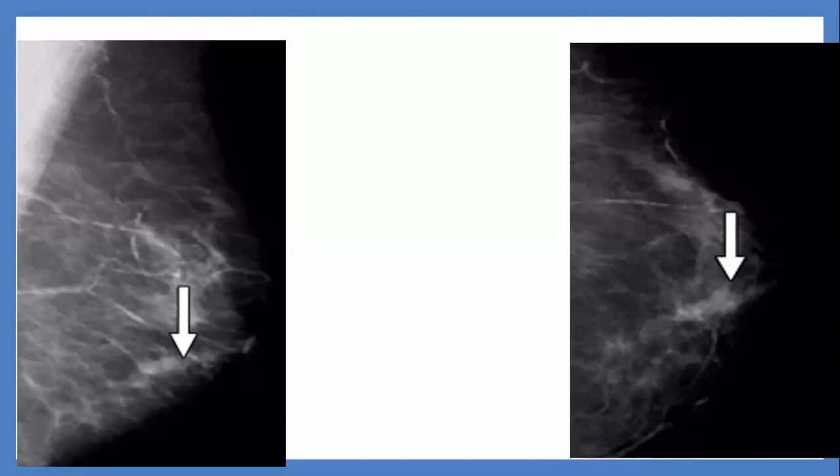Okay, again, can you describe it? In the lower inner left breast, there is what? Is it a mass or something? Looks like an inverted opacity. What is the shape of this opacity if you look at the MLO? Tubular. Yes, you have a tubular opacity radiating from the nipple. It should be expected to be of ductal origin or the inverted nipple itself.